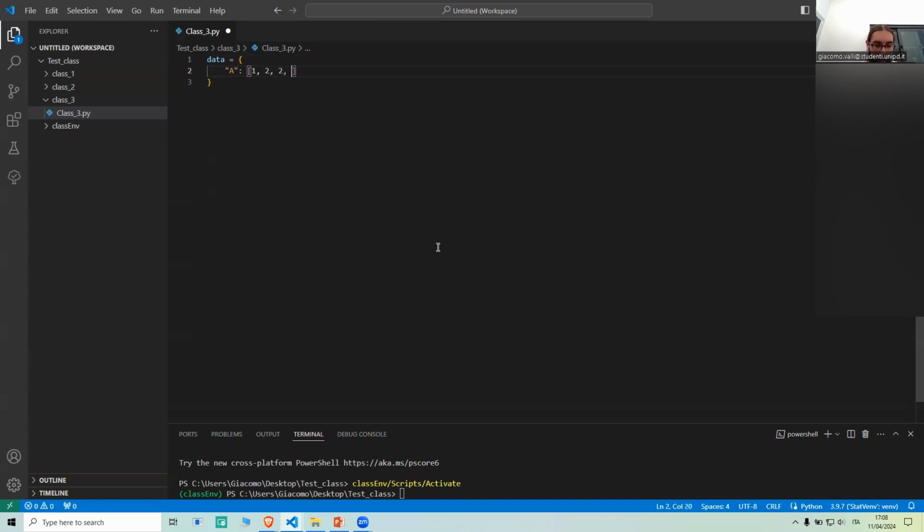So in this case, my list is going to be this. And what I'm doing here is creating a dictionary that contains a key A with 5 elements inside. And you can simply understand that when you build a table from this dictionary, the key will be the name of the column, while all the elements will be the elements contained in the rows. So if I create a collection of more than one element, I just copy and paste it to not spend too much time on that.